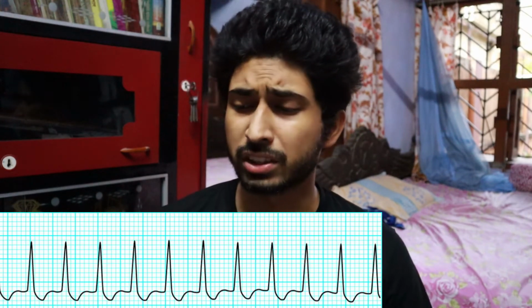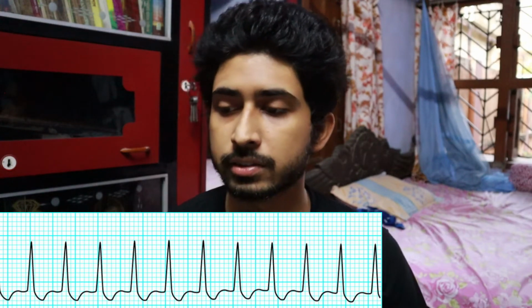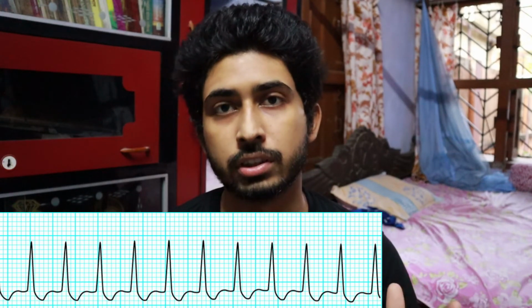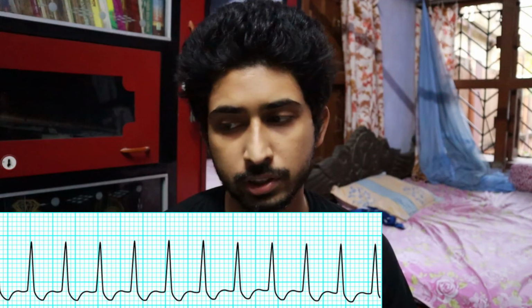On your screen you can see junctional tachycardia. Now, junctional tachycardia is quite similar to AVNRT. The only difference is that the rate of the tachycardia is slightly less in junctional tachycardia, which is less than 130 beats per minute. But in case of AVNRT it is higher, normally more than 180 beats per minute. But otherwise it is quite the same. There is no P wave that can be appreciated in this ECG.